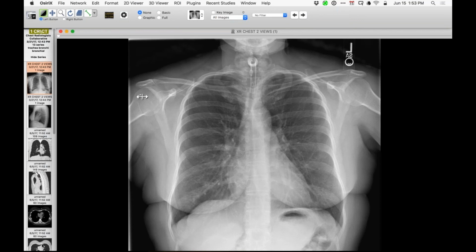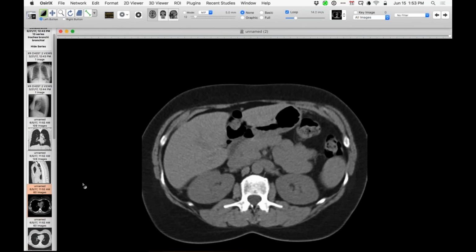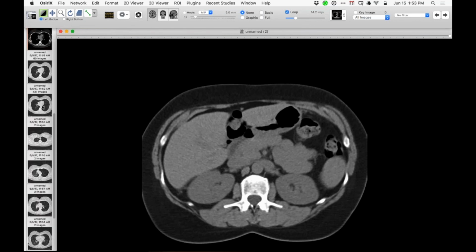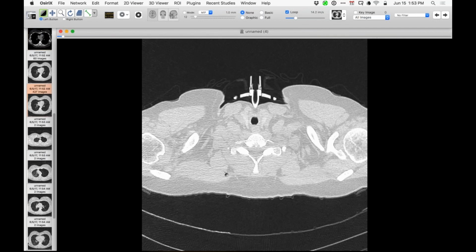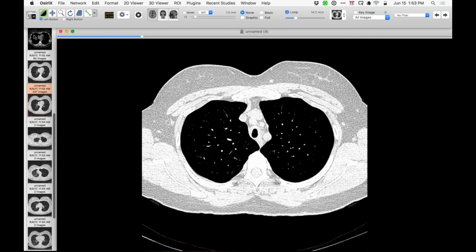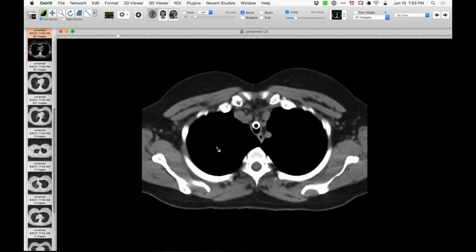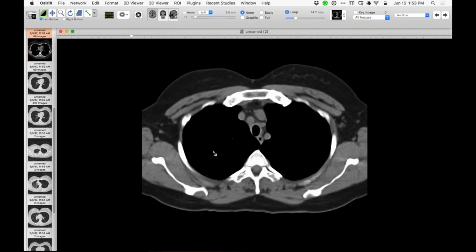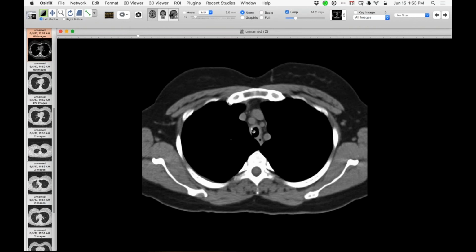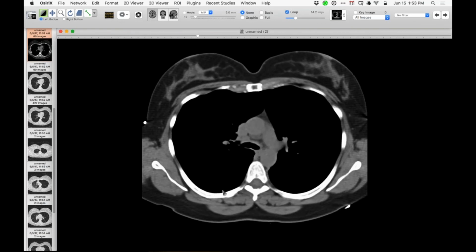And then when we looked at the CT, and when Leif looked at the CT, let me bring this one up. I don't know if we have thin cuts. Well, maybe we have some. He did notice that in looking at the, maybe I'll start off with non-thin cuts. Looking at the appearance of the trachea below the level where it terminates, you can see that the anterior portion of the trachea is narrowed and the posterior membrane portion is not narrowed, and perhaps the same phenomenon right here.